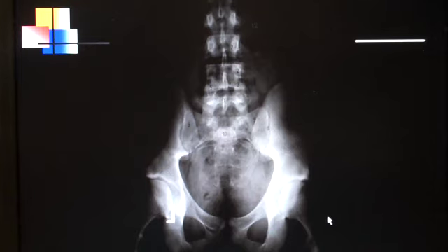And when you're looking at the ischial tuberosity, you sort of wonder about that ischial spine, and you can see the ischial spine is right there. Ischial spine is going to be medial to the femur head. Usually it shows up inside the cavity, but this one you see is sitting right there, just medial to that. That sideways V shape. Down here, of course, would be the inferior pubic rami.